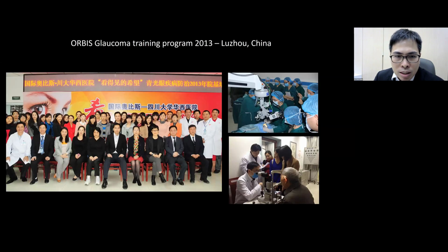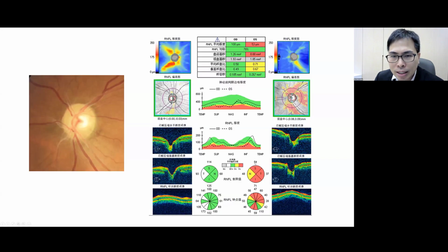I had the opportunity to attend this program organized by Orbis in Sichuan, China. We had a team there doing operations and doing some assessment for glaucoma patients. And here is an OCT given to me, of a patient they had been treating as glaucoma for many years. And this is the OCT printout.